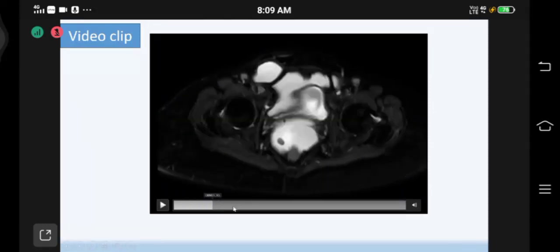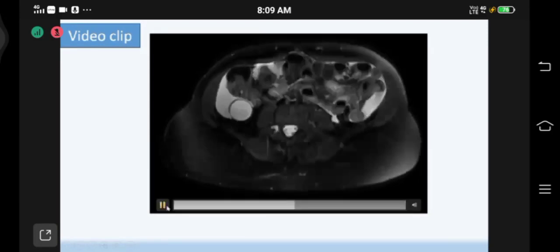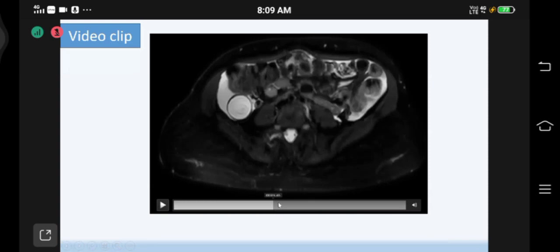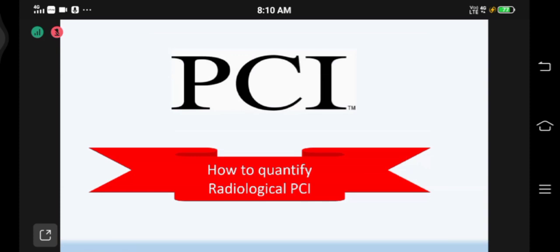Now coming to the wagon wheel approach in these particular cases. You can see the abdominal subcutaneous fat, the abdominal wall, and then this layer, where you can see some nodular deposits along it. So this is the omentum. The second layer is the bowel. The third layer is the mesentery, and as you go deeper, the deepest part is the root of the mesentery, right? This is how you need to systematically approach when you look into your axial images.